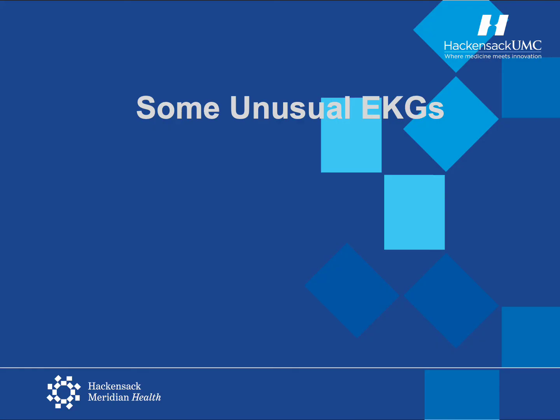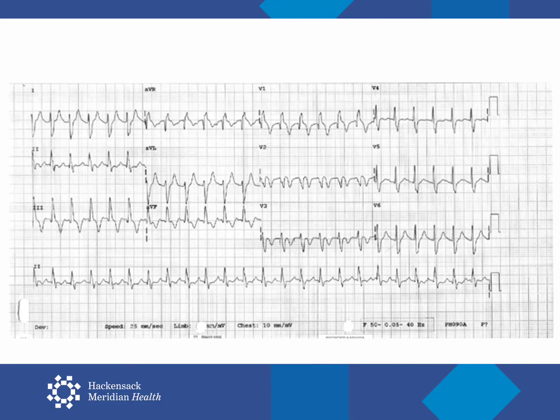So the bulk of what you'd usually see at triage is over. Now we're just going to go through a few rare and unusual EKGs, which you might want to notice, and they could sometimes be important. Patient presents with shortness of breath. Look at the tracing. You see a right bundle branch block with T-wave depression at V1. This is suggestive of right heart strain.